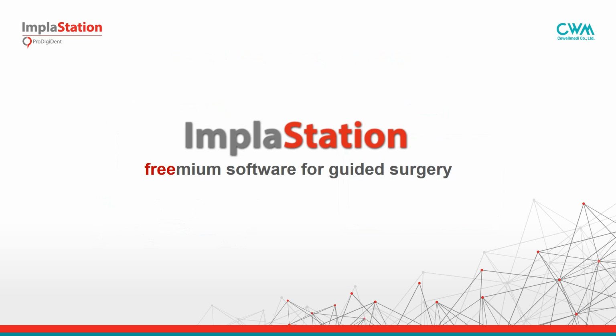Let's start with the software. In our case it's ImplaStation. ImplaStation is freemium software for guided surgery. I'm sure everyone is familiar with this business model. Almost all messengers like Viber, Skype and others use this model. The core, most of the features are free and some are paid.